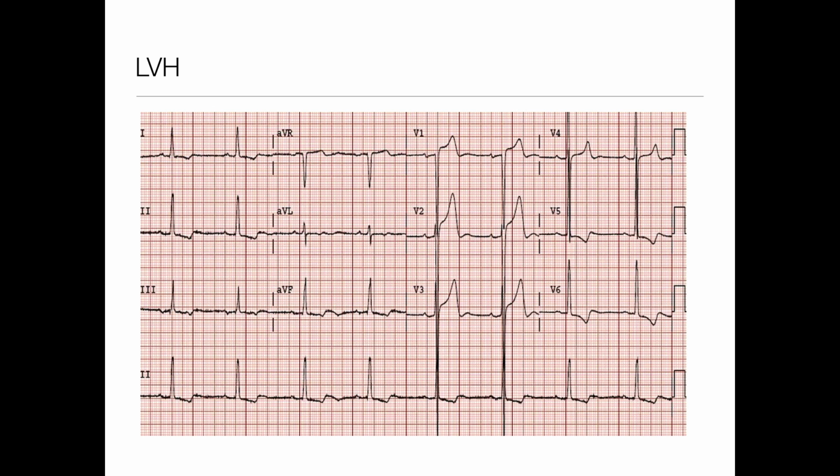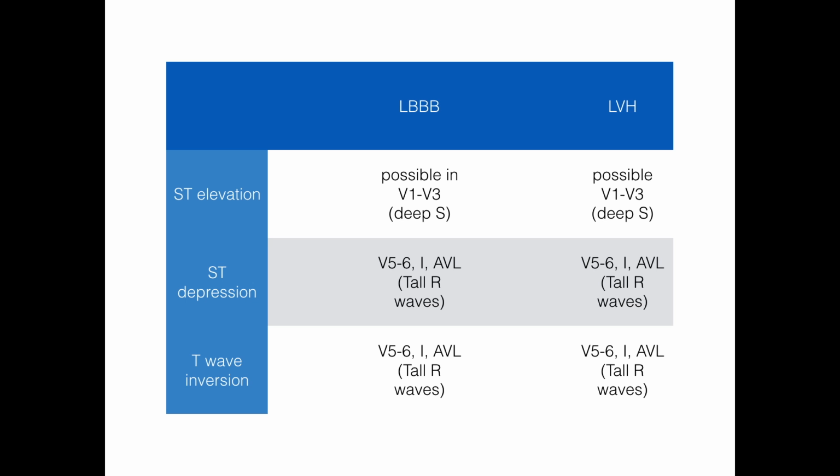So you don't even have to count the number of small blocks. You know there's going to be more than 35 here, and so this patient either has left ventricular hypertrophy or is a very thin, athletic person, sometimes we can see this. But the main point here, left ventricular hypertrophy is going to cause ST elevation, and it's another cause for it.